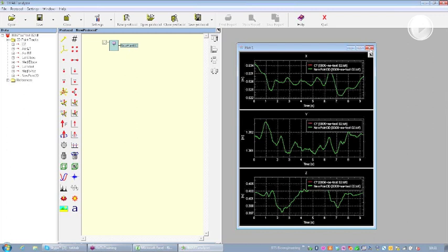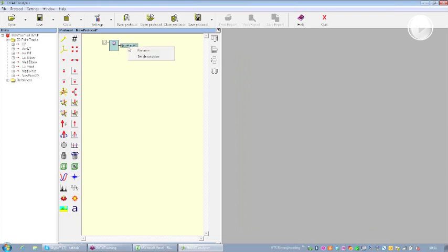So I change the name, so I can rename the output, call it C7I, that stands for interpolated. I can copy and paste this operator as many times as I want in order to have it on the other markers.